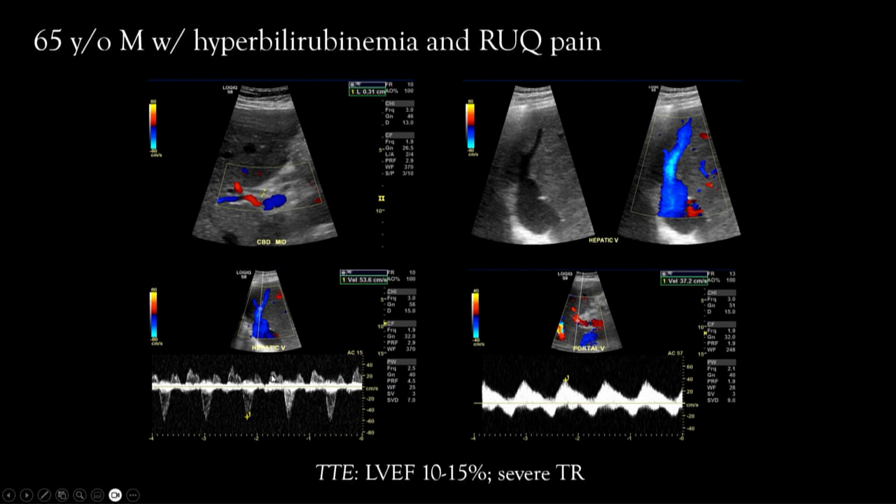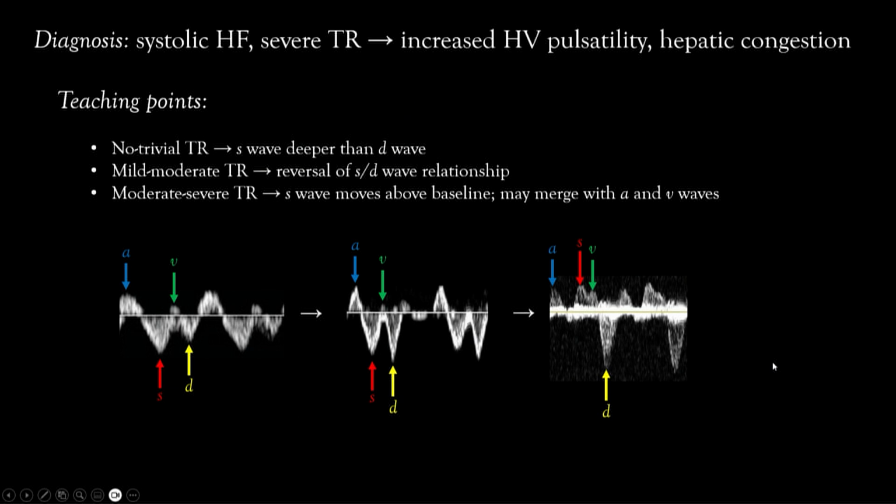This is what we suggested based on the ultrasound. The patient went on to get an echo, and the patient had heart failure and severe tricuspid regurgitation, confirming our suspicion.